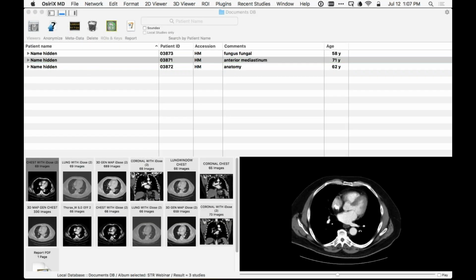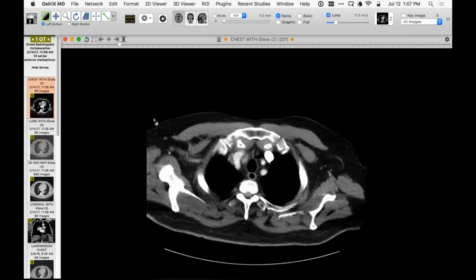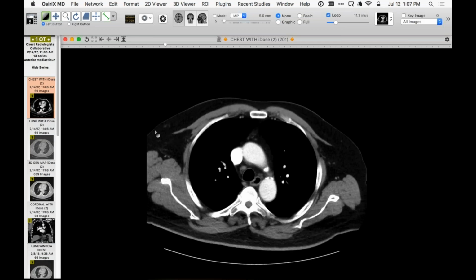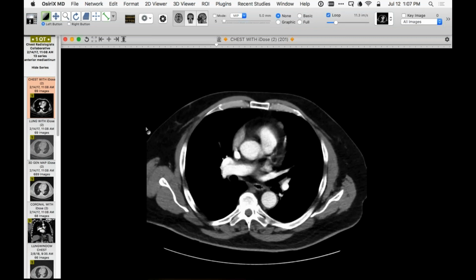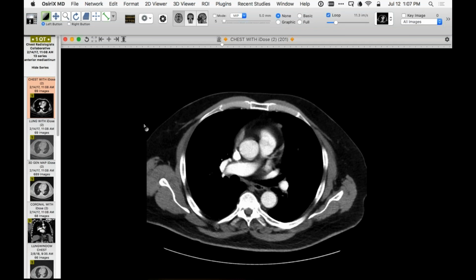All right, this is kind of an interesting case. What I know about this patient is the following. The patient has a history of colon cancer. At an outside institution, he was followed for that, and these are CTs from the outside institution. As best I know, he was referred here to thoracic surgery because of surveillance imaging that showed an enlarging opacity.